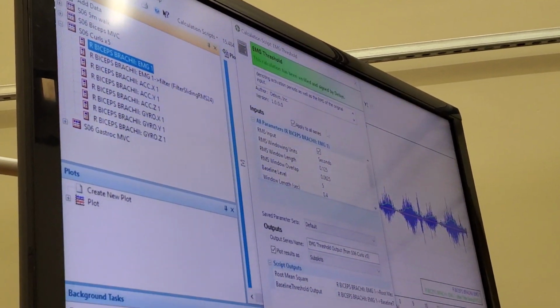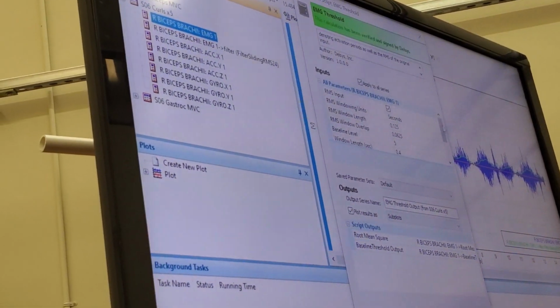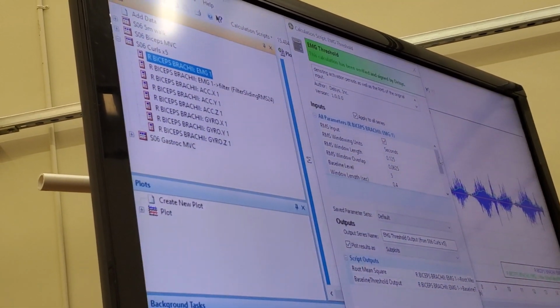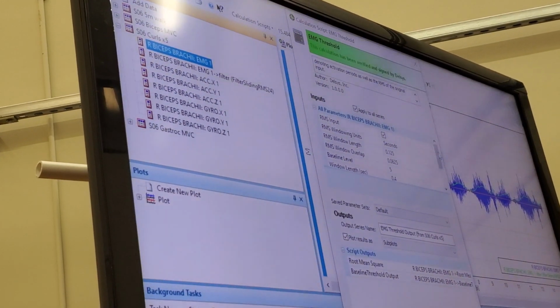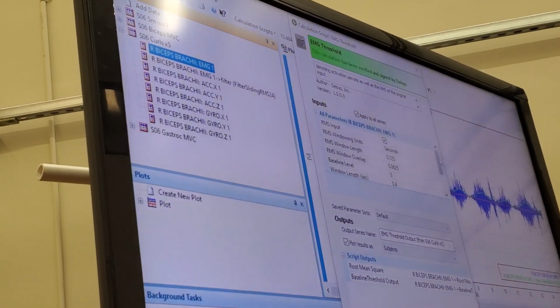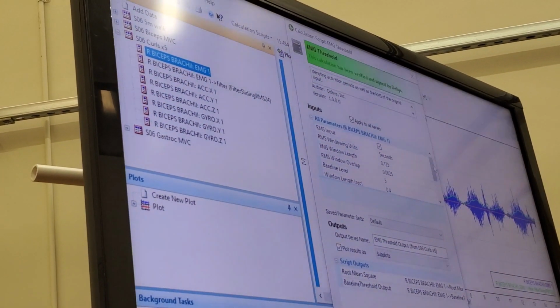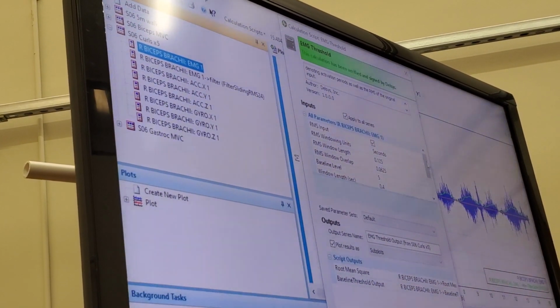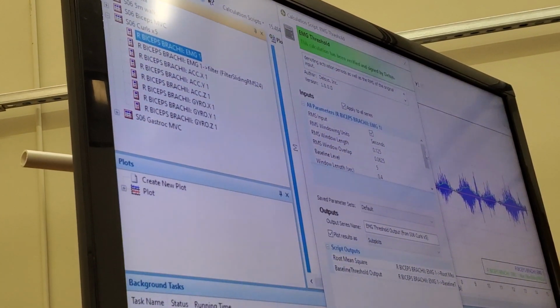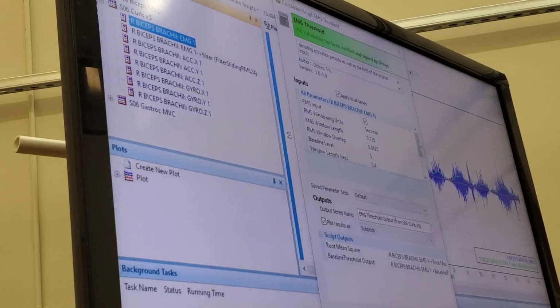All right, so that's the way to get the information of, okay, so it stops, and you'll see when we next look at Excel, you can see exactly where it stops, and then when another contraction comes in. Now, the time between contractions is probably not experimentally relevant for this collection.